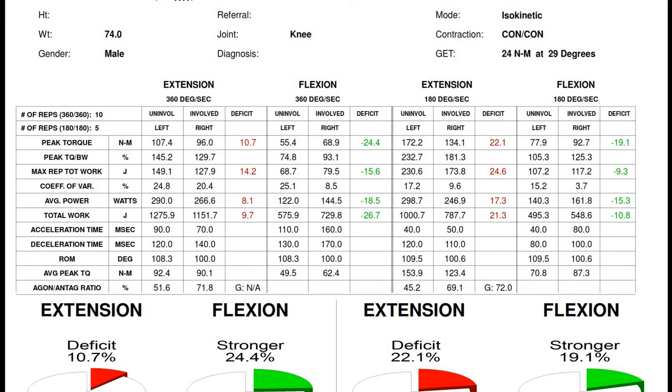Was the dynamometer head in the correct place? Did I replicate that well on the other limb? Sometimes you will even see the coefficient of variance come down with experience. As long as you've set the test up correctly, you've set the chair up and the participant is in the right position, everything's good to go, then coefficient of variance can be linked more to the participant themselves and that there's something going on.